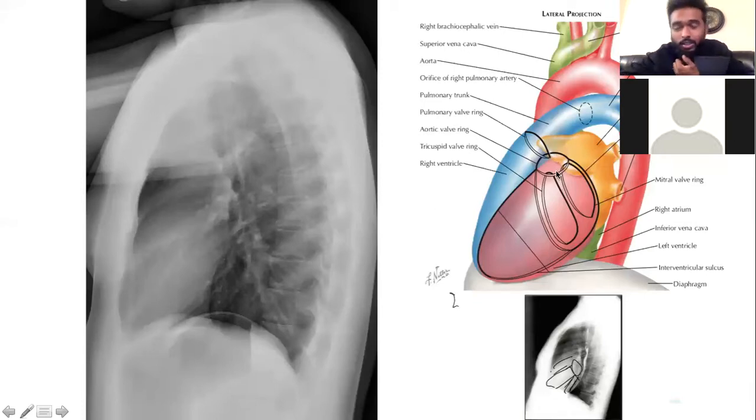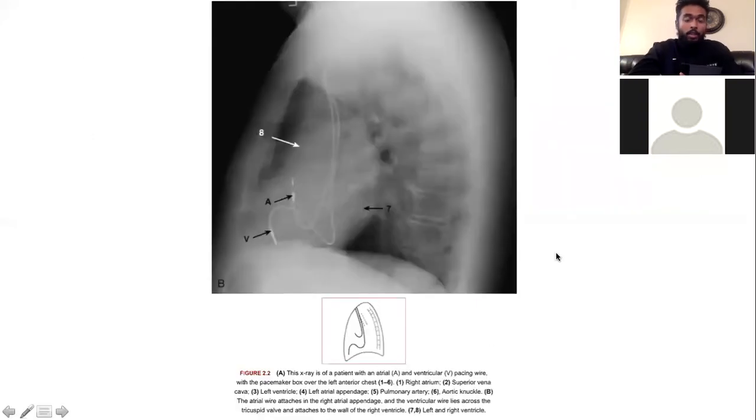Does that make sense? Is that in every case? Yeah, I think there's a picture that'll show you, if you see an artificial valve and you're wondering if it's aortic or if it's mitral. I think the aortic valve moves more. It has a more vertical representation. But if you draw a line like that, that usually sticks.